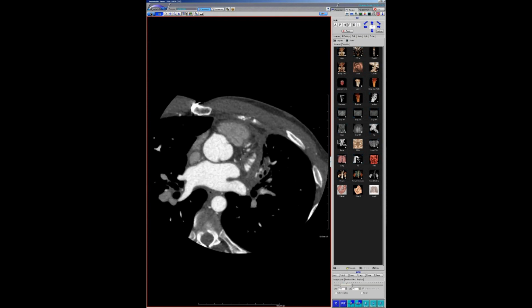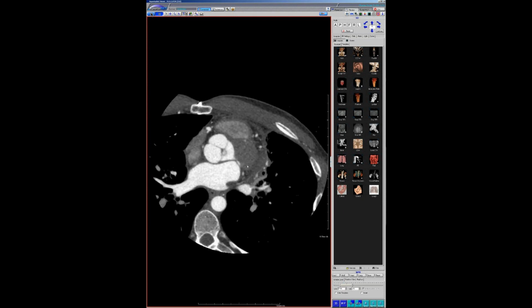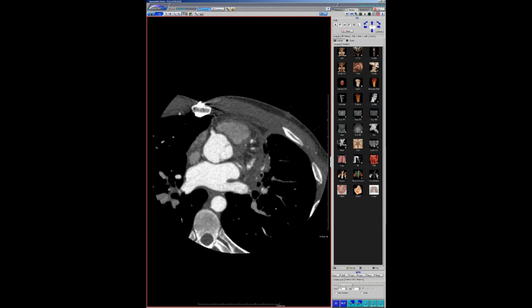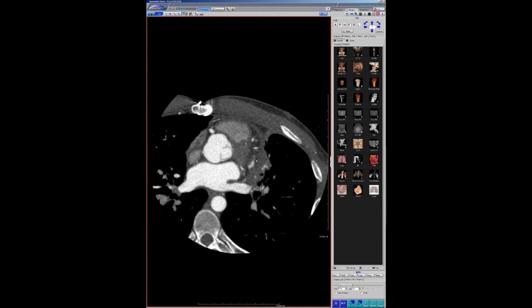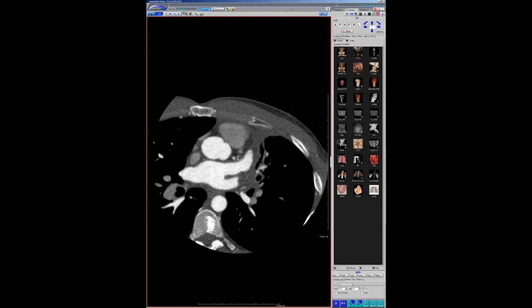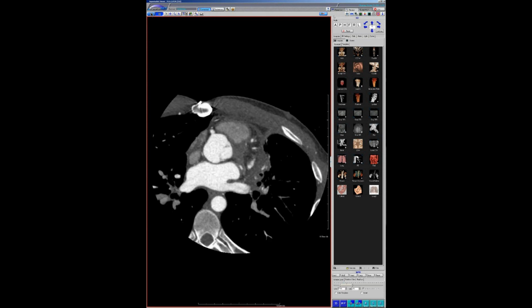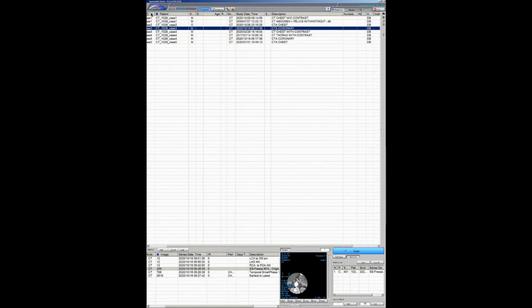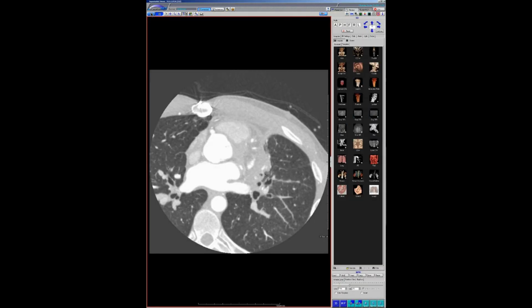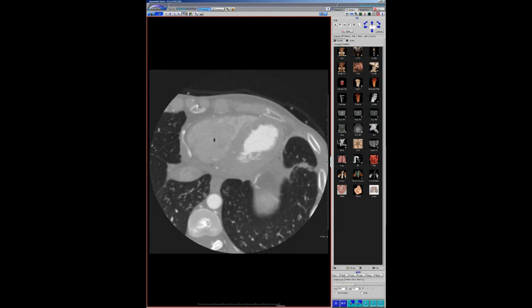This is a case I read the follow-up on, and I think it's very important for people to get terminology correct. So this was a trauma patient, and this was read as an intimal injury, or an intimal flap, and the history on all the follow-up imaging was saying, oh, it's follow-up dissection, because they read intimal flap. I think people can see that this is not a dissection in the standard sense. This is a pretty traumatic, severe shear injury. He was a pedestrian who got hit by a bus.